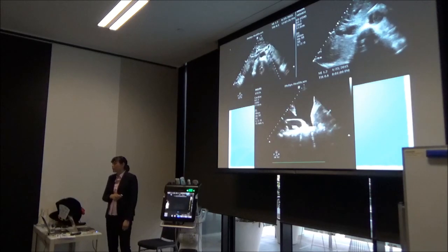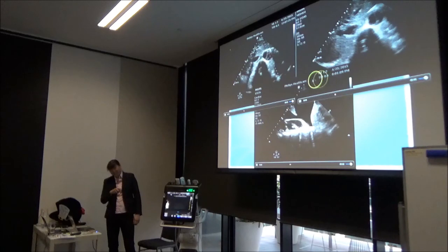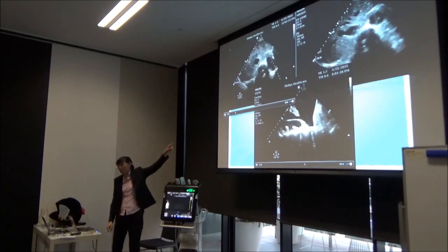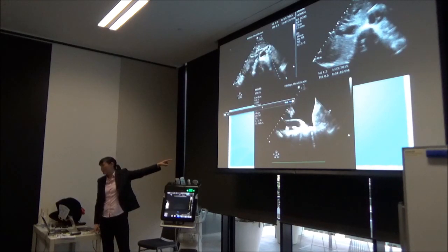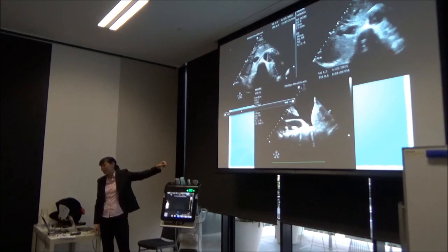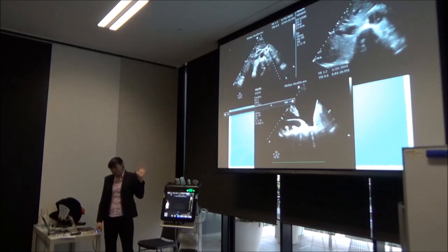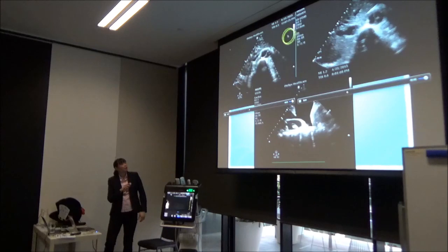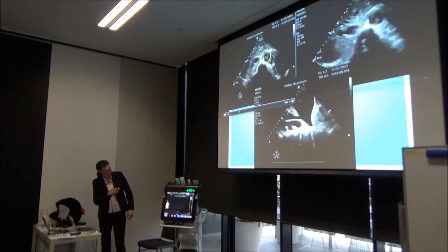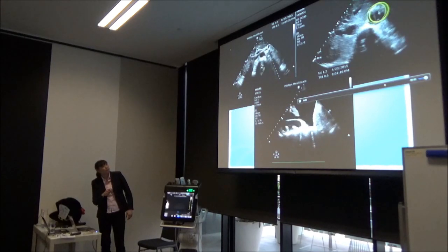These are a couple more flagrant examples of dissections, and this is literally one of my favorite pictures ever, because you can see the aortic dissection through a pleural effusion. And the providers didn't realize they were picking up the aortic dissection because they thought that was the heart, and forgot that the heart does not directly overlap the spine. Yes, so fortunately they got a CT and didn't miss that. But here is your dissection flap right there, and dissection flap with a tether ball in it right there.